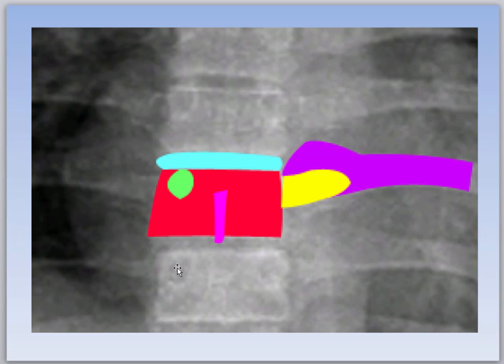What the heck are these things? Why do they look like that? Well, remember, this is the most dense region of bone, so they show up pretty thick. And they're very important. Metastatic carcinoma, especially breast cancer, likes to eat these away. Osteoid osteoma is a non-cancerous tumor, usually, that can make this look really white, and you'll learn about that, but these are important to be able to see the pedicles. You can see them here and here as well.